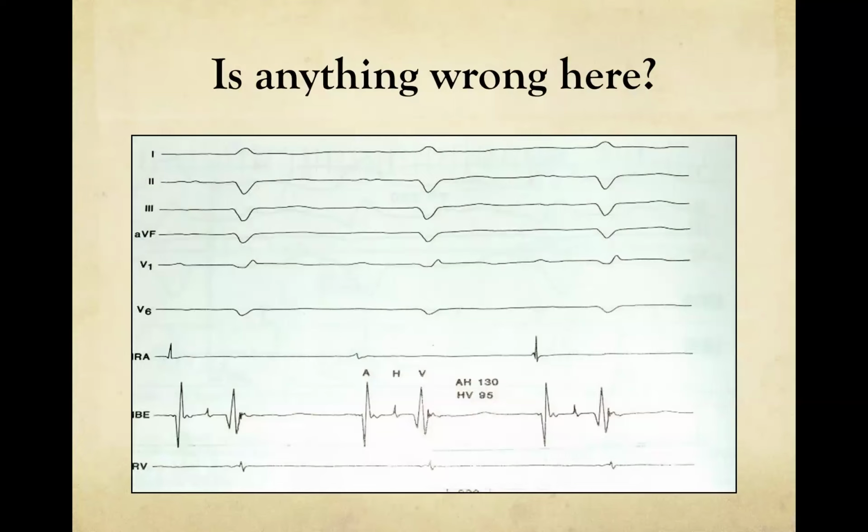Okay, this is an intracardiac tracing with some surface electrocardiograms. The question posed is: is there anything wrong here? So, anybody have any thoughts on this?